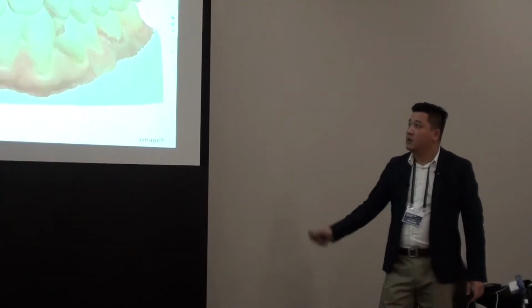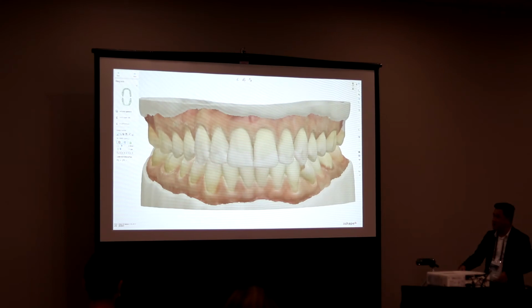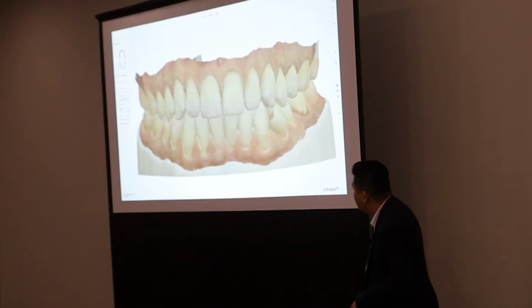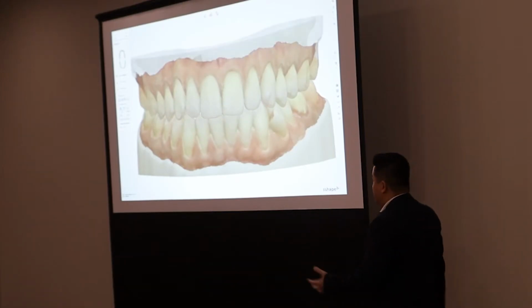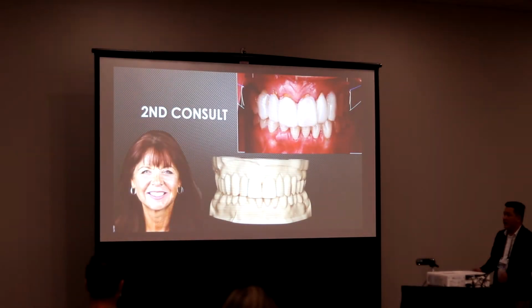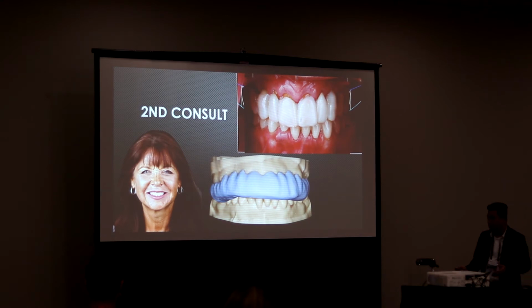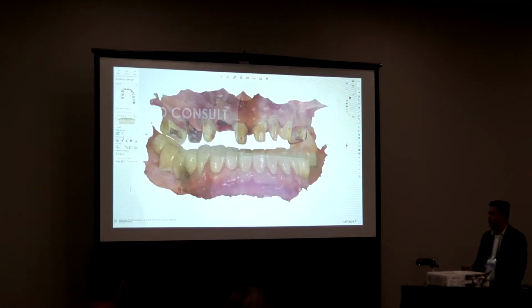So of course, we bring this into Model Builder, and you just attach the files very quickly, and then it'll append everything there. You can also sculpt these and make sure it's all nice and smooth. But you get a very nice 3D digital diagnostic model that you can, of course, at that point print off, and we produce the models for a composite mock-up intraorally that we can use kind of as our roadmap for the rest of our treatment.